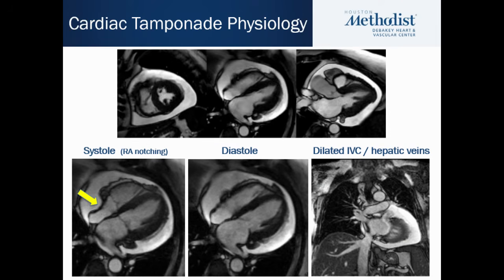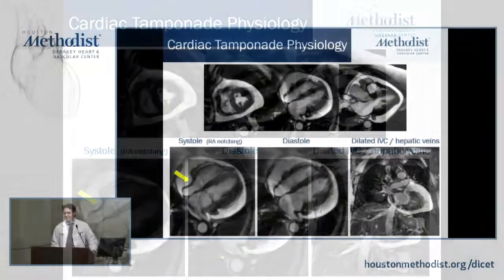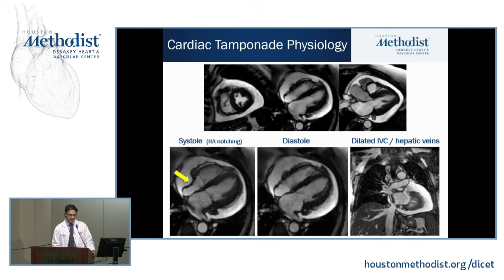So every now and then, it's not common, and neither do I recommend this test if you're trying to diagnose this condition, we get a patient in our scanner who has cardiac tamponade. You have to be very aware of the signs and symptoms, at least the MRI findings of this.